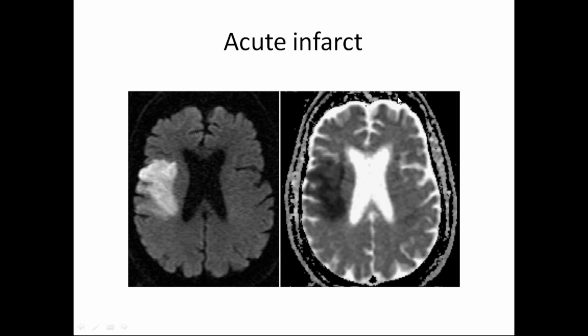So when the MRI is done and you want to know whether the patient has an infarct or any other pathology, you can just ask the technician to please show the diffusion sequence and ADC sequence, and he'll scroll through the images. And if you notice any bright area within the brain, usually it should be low intensity signal throughout the brain in the diffusion sequence.